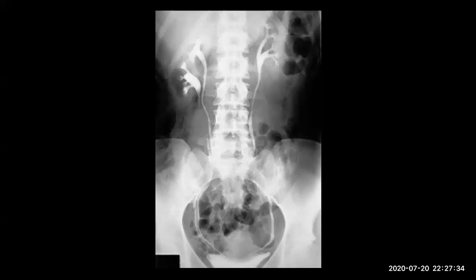No obvious abnormality, no filling defect, no apparent dilatation. Okay, you said this is intravenous urography or intravenous urogram? Which is better? Urogram. Okay, so this is an intravenous urogram.